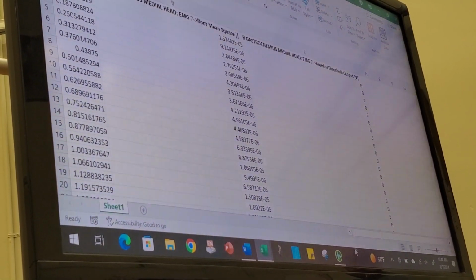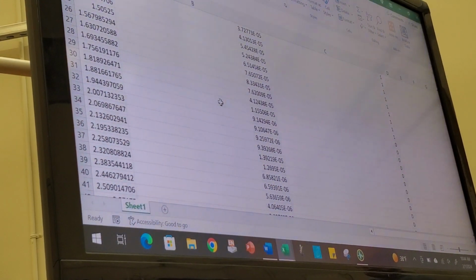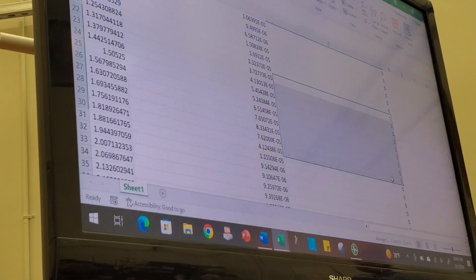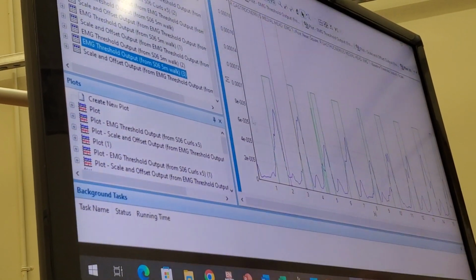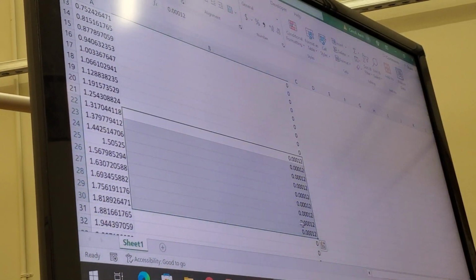You also notice if you go into the threshold analysis without doing the scale, since everything is set at a standardized 1 for that scale and offset, everything will be shown as the same number, but it would be whatever you set your fixed scale to be.